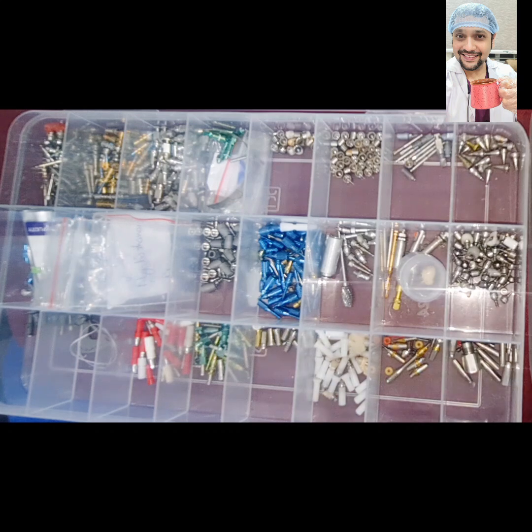So this is the basic thing which you have to understand when it comes to the implant level. So as a revision again, after the cover screw, you have healing abutment, you have impression coping or scan body, you have physical analog or a digital analog, you have a master cast in the form of a die cast or in the form of a printed cast, and then you can either use a stock abutment or UCLA or milled or DMLS abutments to prepare either screw retained restoration, cement retained, or screw cement retained restoration. This is all about the implant level.